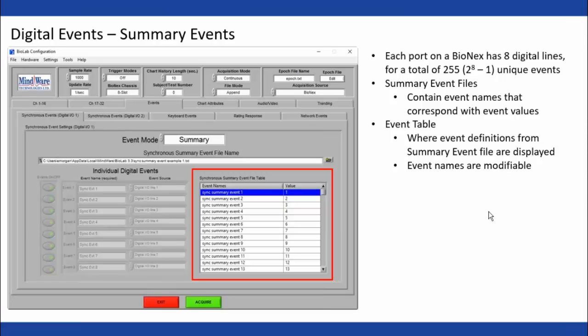Okay, I have a question regarding keyboard events. The question is whether the event is marked when the key is pressed or when the node is finished. So this is specifically for F11 events. When the F11 key is pressed, you'll be prompted to enter your event name. And the question is whether the event is logged as soon as that dialog appears, or is it logged after you fill out the event name.